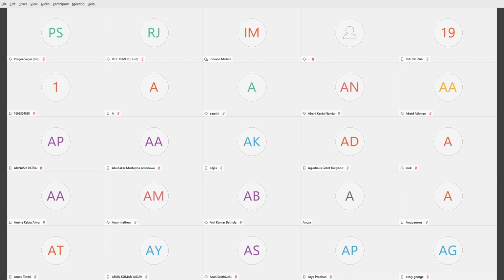But there are some patients, for example, where the hemostatic clips are right at the edge of the pelvis. They are right beside the muscle, for example, the levator ani on the pelvic diaphragm. There I wouldn't go up to them. Or if I have a doubt, I'd ask my surgical colleague.